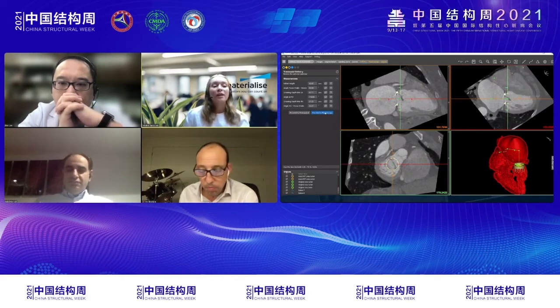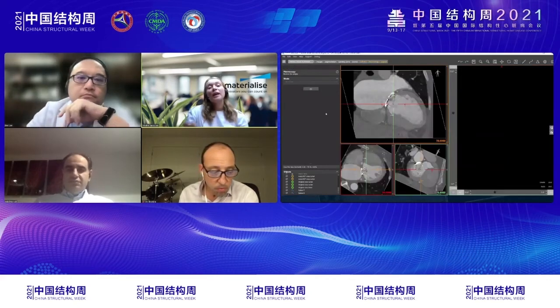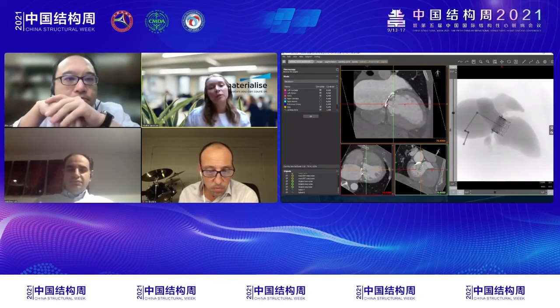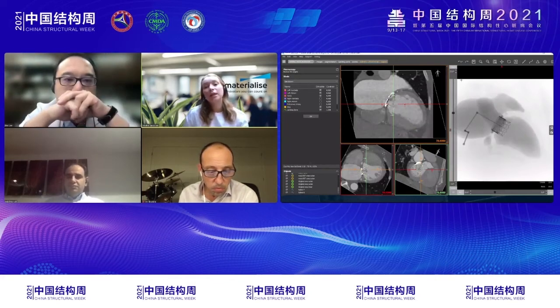Yeah. Thanks for commenting. I will move now to the last step of the export, and that is the fluoroscopy step. So in the fluoroscopy step, it's really the goal to simulate the angles that you will need.